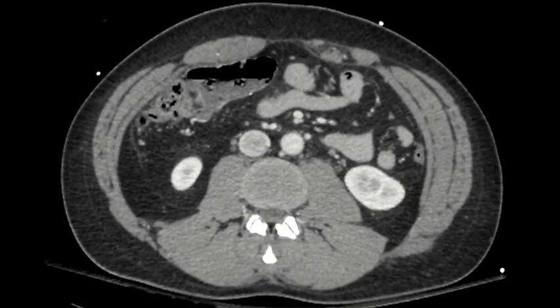Today I wanted to go over a trauma case that we had in the ER here. This was a patient that was moving at high velocities within a car, and the car struck a tree. The patient was then ejected from the car and was brought to UC Davis via helicopter. So I want you to focus your attention on the aorta here.